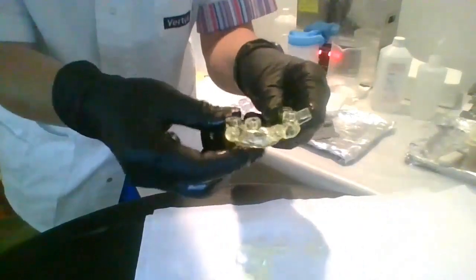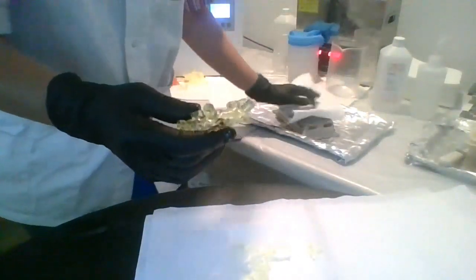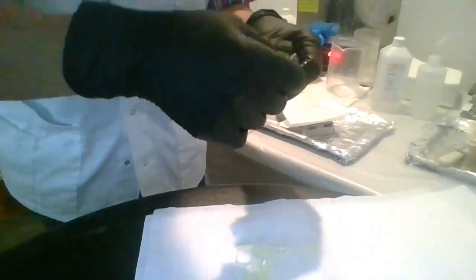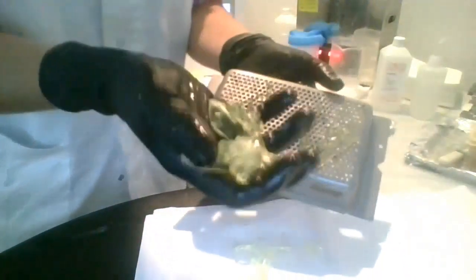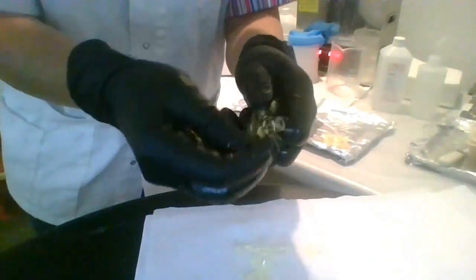Now the thing about it is, one of the tips I like to tell people is also to make sure you do this right away. You don't leave it sitting out in ambient light. I was sure to cover this with a napkin because I had a couple things to print for you today. Things will begin curing. So remove them from that build platform, rub off the supports, so this way they don't keep curing, okay? Even if you put them in alcohol with the full supports, they will begin curing and you will experience more scarring, okay?